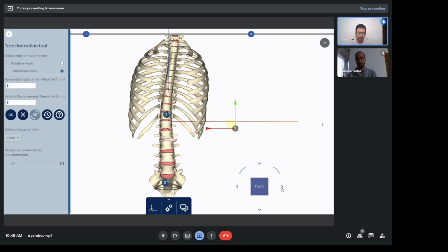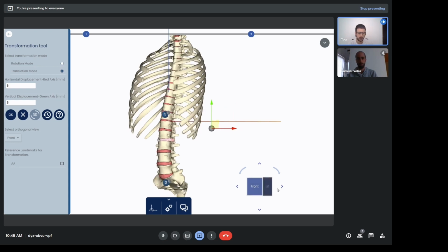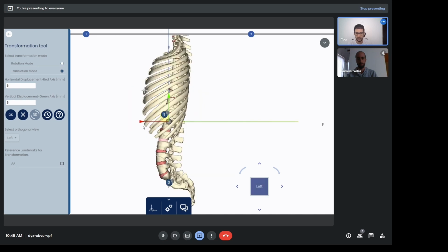You can dynamically switch to a different view, set left, and you can perform orthogonal translations that combine all together. So what's interesting about that is you can do translations that are concatenated in different planes by moving around, and they combine to an overall translation at the end. You might just click OK on that. I'm just going to disregard it for the sake of the example here.